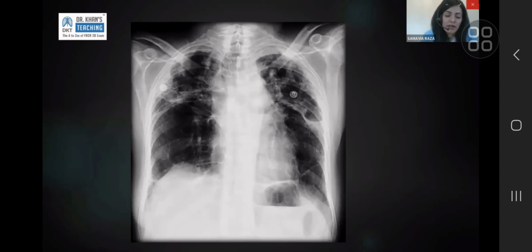When it's stage 4, then the diagnosis isn't that easy to make, because you have a lot of other diseases that can give you upper to mid zone fibrosis, and sarcoidosis happens to be one of them. On a chest x-ray especially, the appearances are very non-specific. They can be asymmetrical, they can be symmetrical, more common. Upper to mid zone fibrotic changes. And then the differential has sarcoidosis in it.